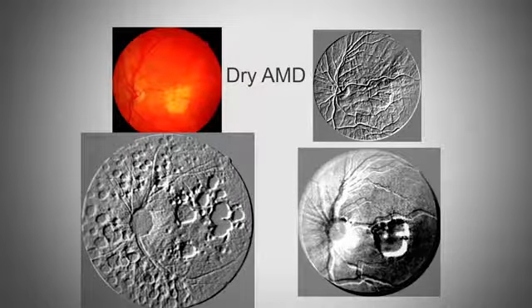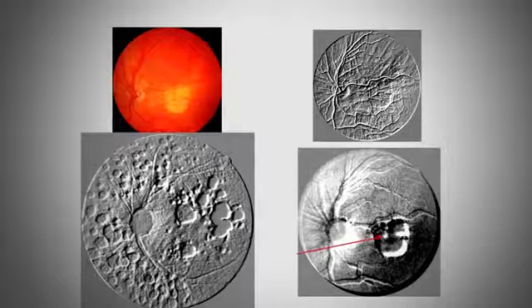Doing the emboss, you can see the topographical view of how much damage there is. All the retina is gone all the way down into the RPE, and that small area of vision that she reported to me, I could see as that white spot that you see there. So she still had vision. When that white becomes gray and then black, the vision will be completely gone.